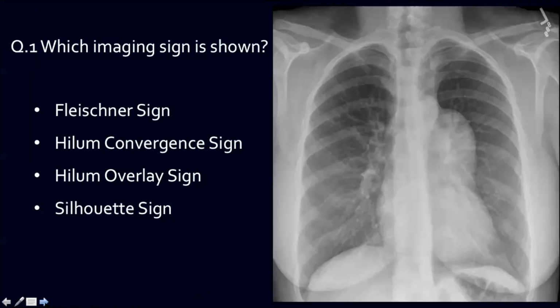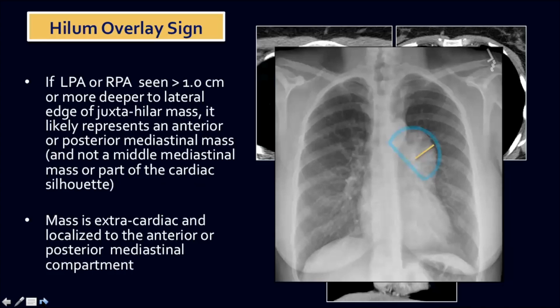So coming to our first question for this talk, which imaging sign is shown here? I'll let you look at the image and review the options here, and you can think of the answer. So the correct answer is the hilum overlay sign.